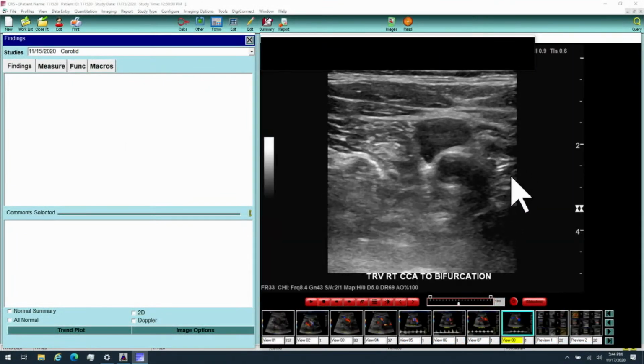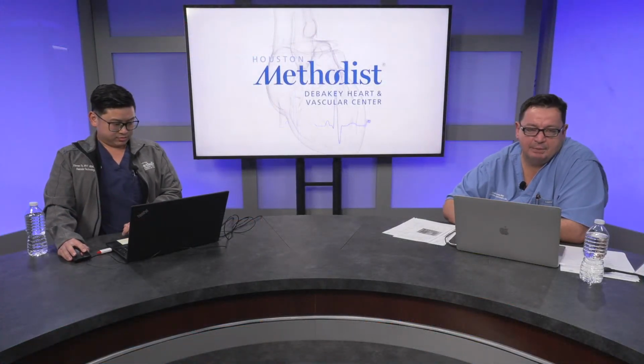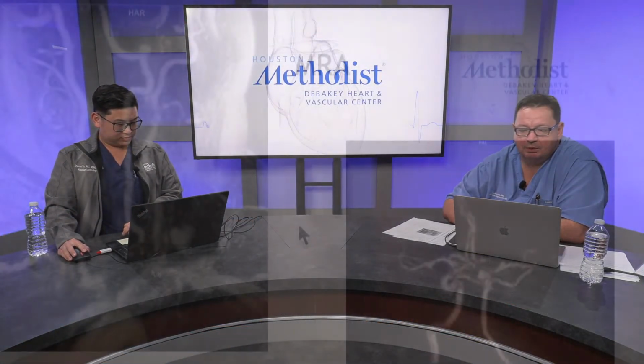So I would like to show you the images we have on MRI and DSA. Can we switch to my computer, please?